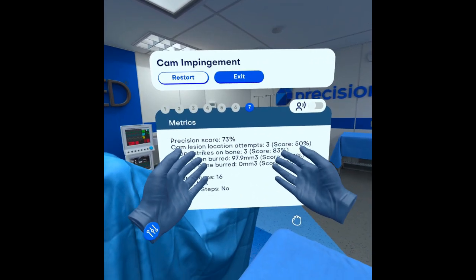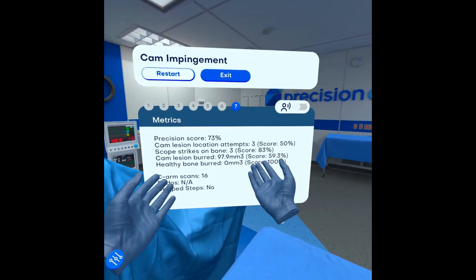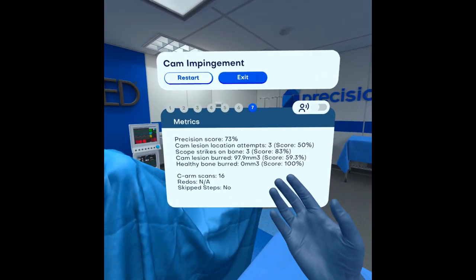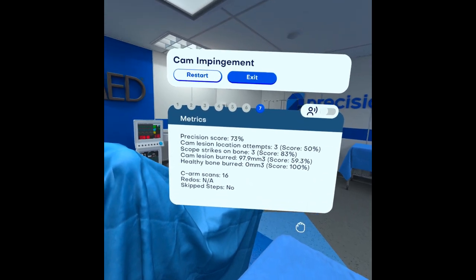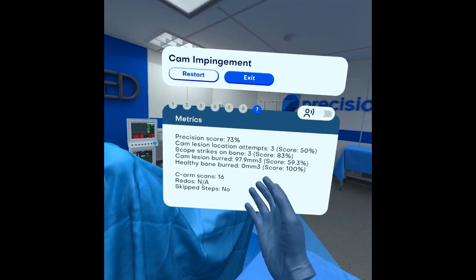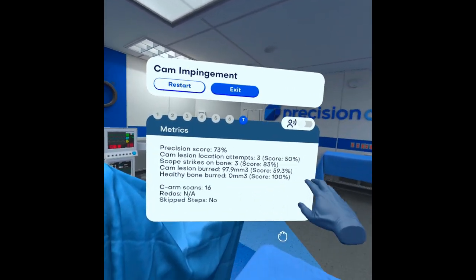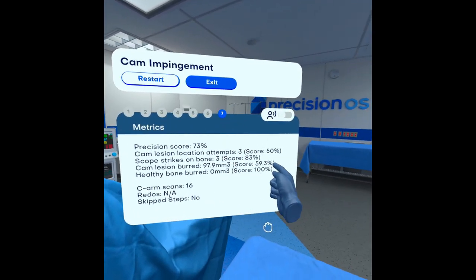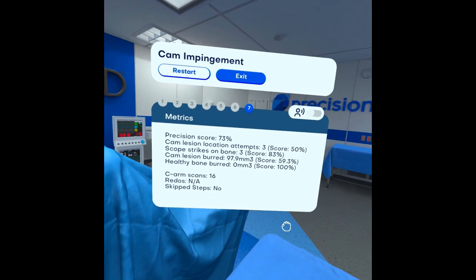And it's this experiential learning of seeing my outcome to therefore improve upon it in subsequent attempts that helps me grow as a trainee. Use this to your advantage. Have your students complete the entirety of the module or just specific substeps in order to generate the scores that are relevant to their development.